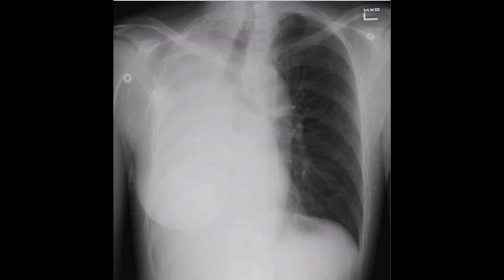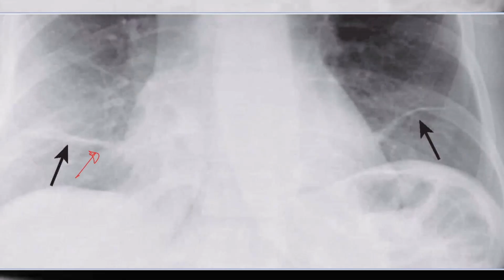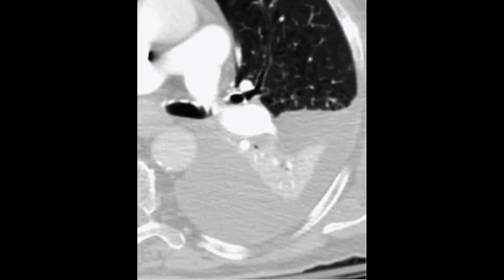So again, what do we think about this chest X-ray? There is total lung whiteout on the right side with a mediastinal shift to the same side. The heart and the mediastinum have been shifted as well to the same side as the lung whiteout, and that indicates atelectasis. This is another example of atelectasis, which is band atelectasis, present in patients post-operatively. And this is an example of compression atelectasis, so effusion surrounding an atelectatic lung in here. So that is called compressive atelectasis.